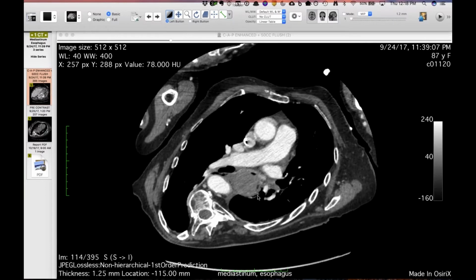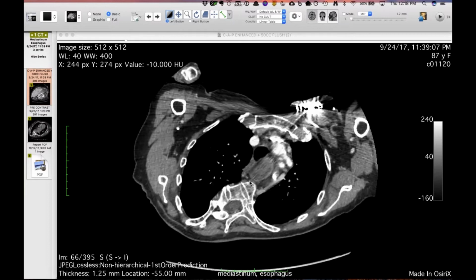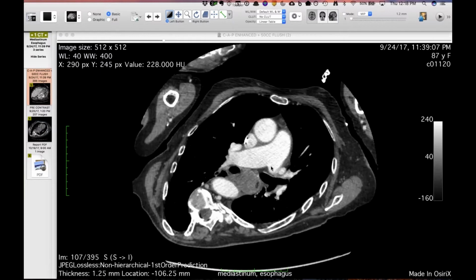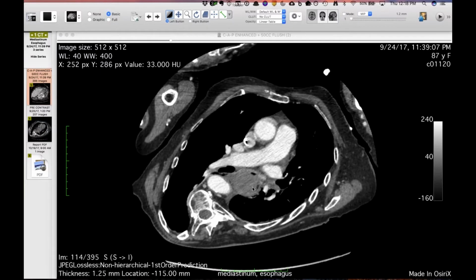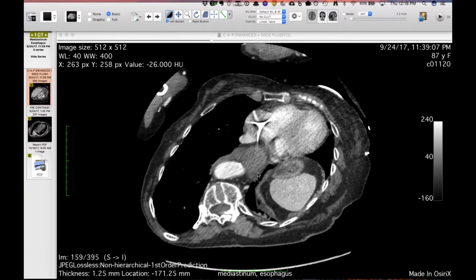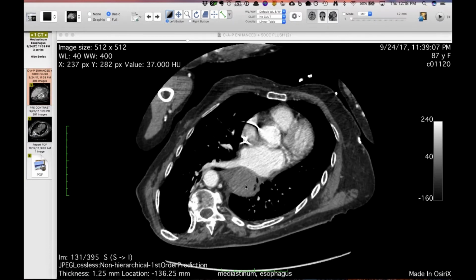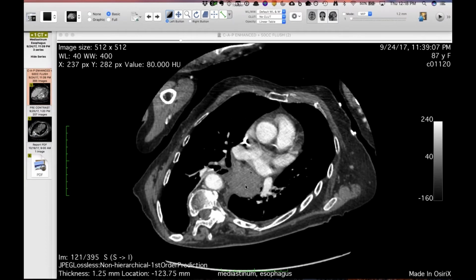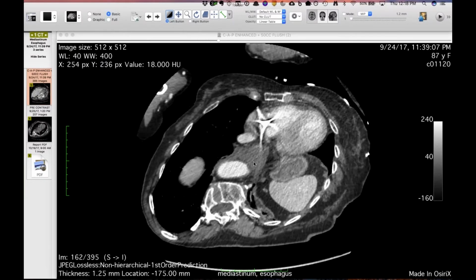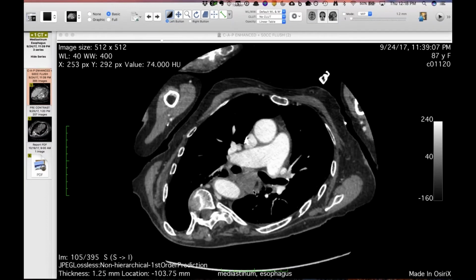And we see that there's this eccentric soft tissue that extends really from the thoracic inlet, looks a little weird up top, and then all the way really towards her gastroesophageal junction. Now we didn't have any history at this time, and we're thinking maybe this is some weird, large, elongated mass. It'd be awfully unusual. There are a couple small lymph nodes adjacent to it. That was the first thing that we were thinking, and then, could she just have retained debris in the esophagus? We thought that was less likely.